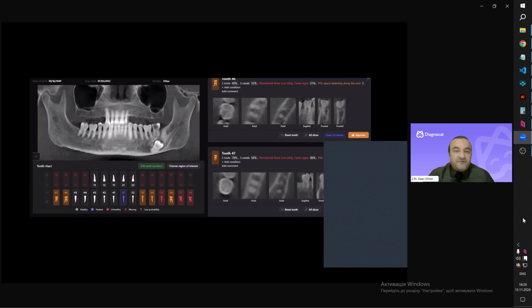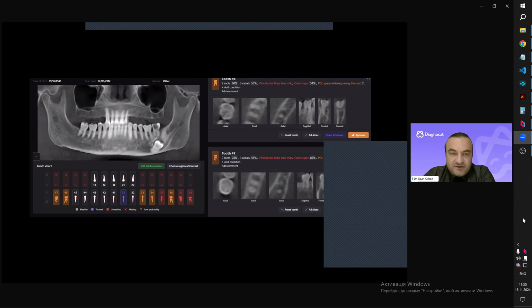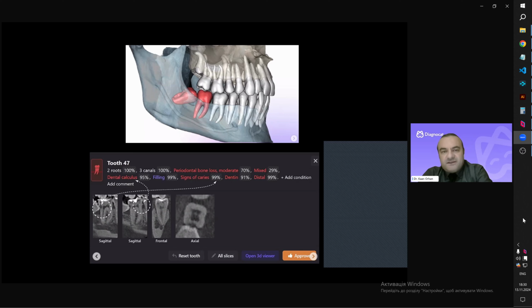Another example, and see in this example, the 38 may also be related with the mandibular canal. As you can see, it's impacted, but there's no 48 at all. All right, let me give you another example for this. There is a beautiful 3D reconstruction of the molar. From this reconstruction of the third molar, you can see there is no relationship between the mandibular canal and the roots.